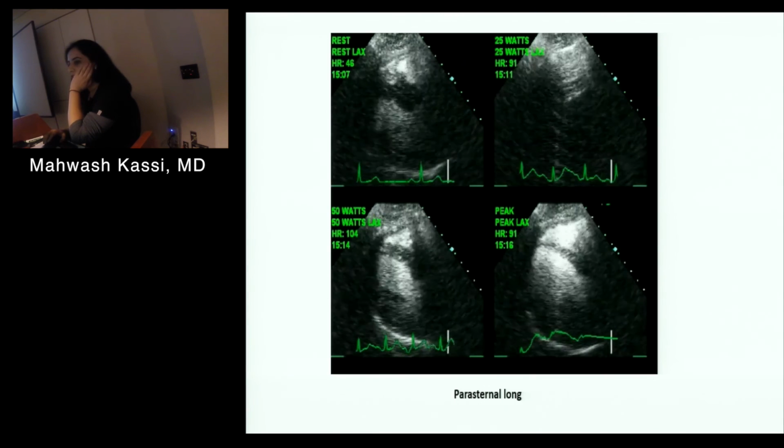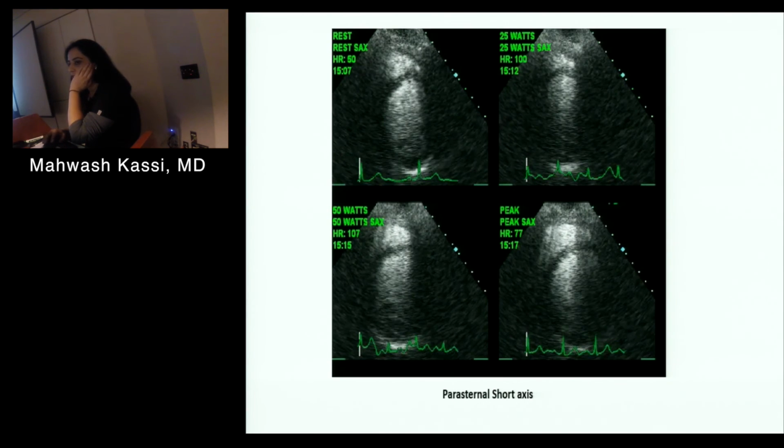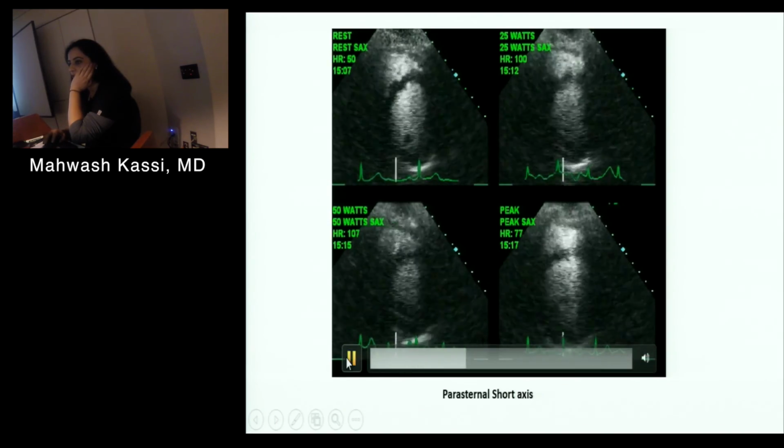Any areas that you see that are abnormal? These are hard, of course. I mean, we all struggle with them. They're not easy.